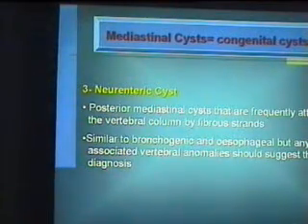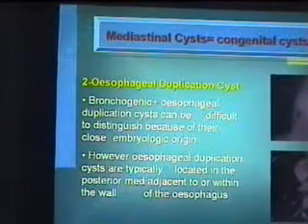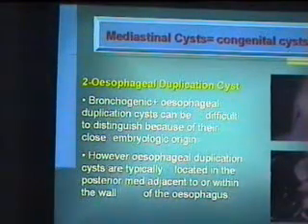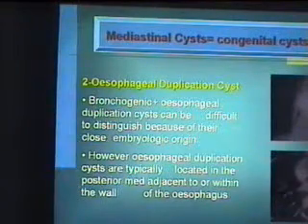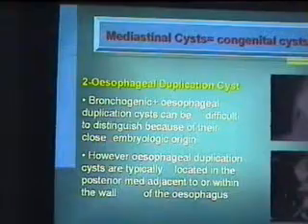وايه يعني؟ يعني رايت سايد. يس عشان الاسوفاجس على الليفت. يعني ميد لاين او لا؟ يعني ما اوكي، ما هي طالعه منها، هي بتبقى جنبيها. اوكي.